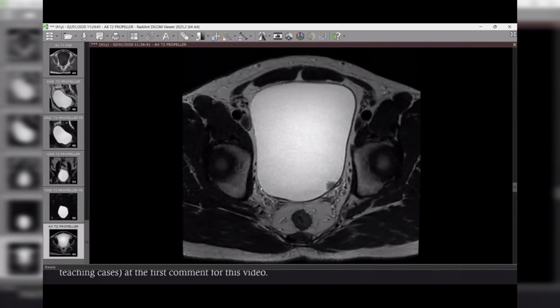If it is hematoma, it will not enhance. Another criterion for hematoma: please take a prone position. If it is mobile, then for sure it would be hematoma. Don't forget this point. But this one is not mobile. It is arising from the left posterolateral aspect of the urinary bladder, very close to the ureteric orifice, and this is an exophytic polypoid mass.